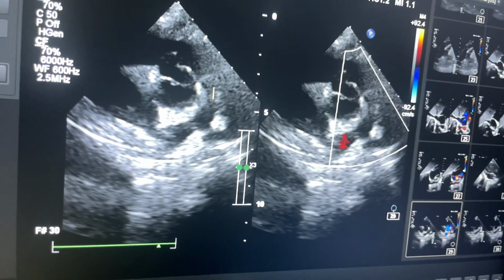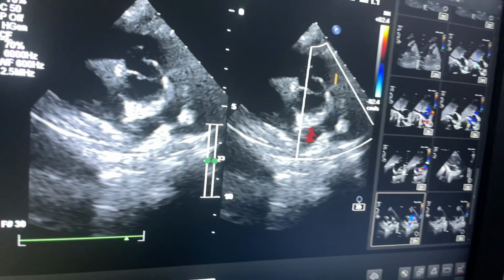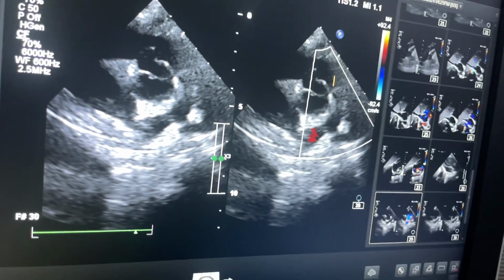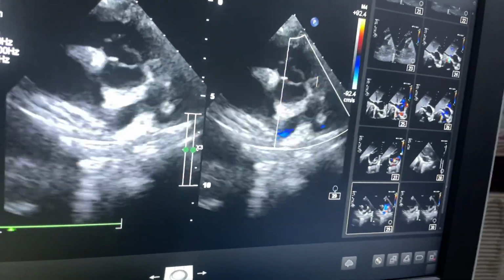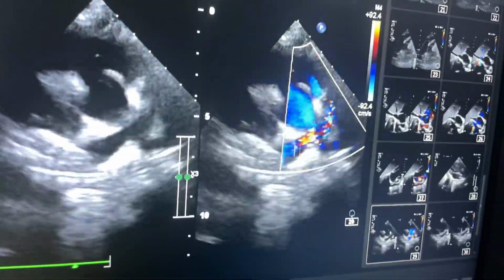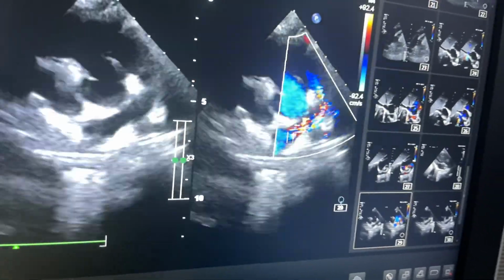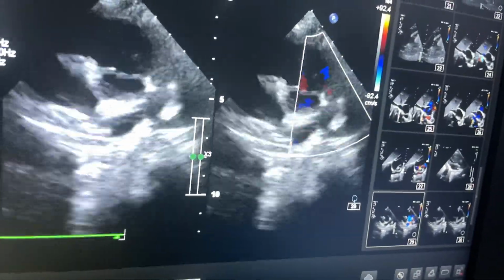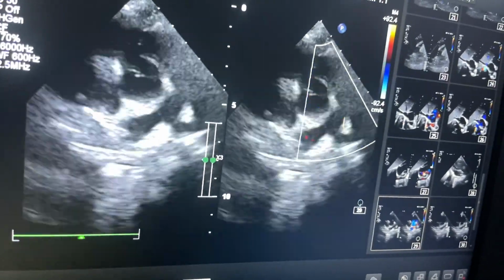That means normally related. Pulmonary artery size was small compared to that of aorta, and there is severe flow obstruction at the level of valve. You can see in this image, obstruction is starting at the level of valve. This is right pulmonary artery branch, this is left pulmonary artery branch. Right pulmonary artery branch is not separated from left pulmonary artery branch, only it is also getting blood from superior vena cava. Right pulmonary artery is connected with superior vena cava.